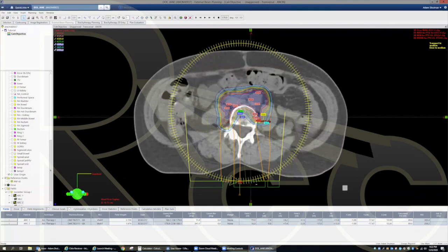All right, let's check this out, see what this looks like.